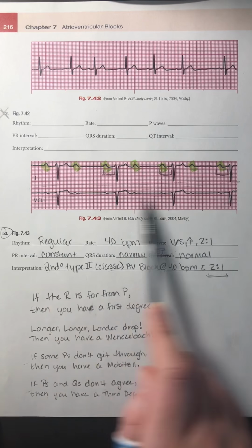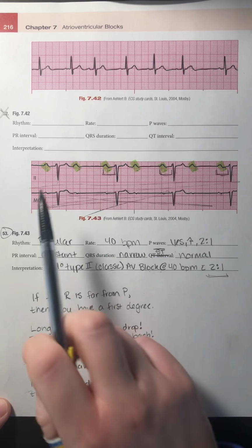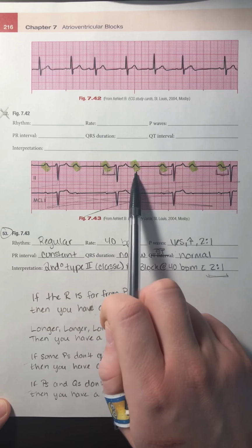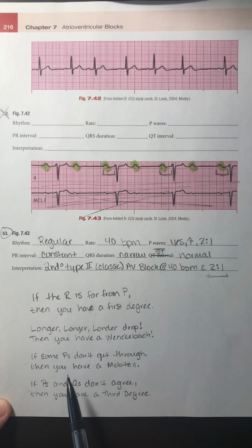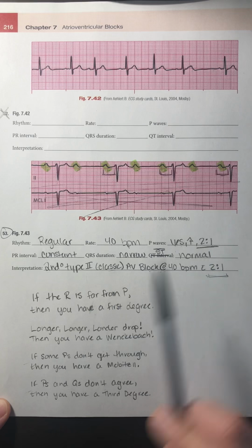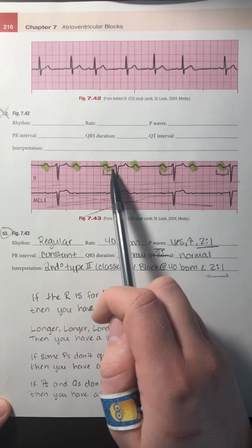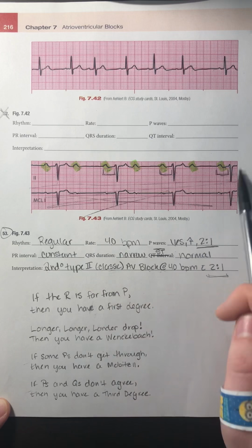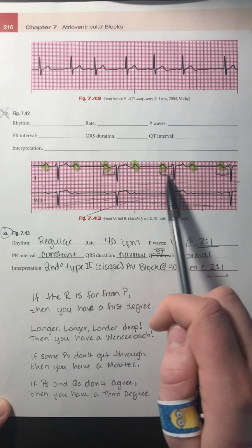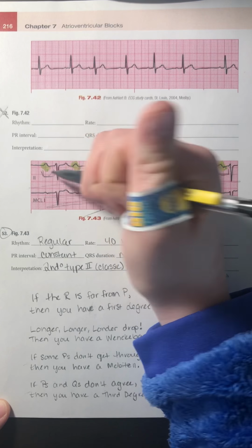I'm not even going to look at this bottom part. It's easiest to see in lead 2, so we're not even going to look at that last part. You can see I have 2 P waves for every QRS complex. They are all upright, they're all uniform, so remember I have that 2-to-1 conduction ratio there. My PR interval is consistent when I do have a QRS that follows a P wave, so I've marked those out here and you can see that it's very consistent.